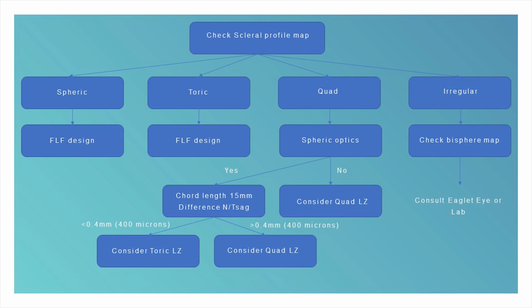So I will dig deeper into what I can do with the bisphere elevation map, what can be the use of the tangent angles map, and lab specific videos. So what solutions do they have for dealing with irregularities like pinguicula?